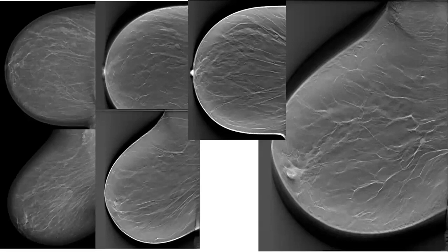This is our case in the system. From the system I brought for you, the patient had multiple small nodules reported as intramammary lymph nodes, and there is one faintly seen here on the MLO, okay?